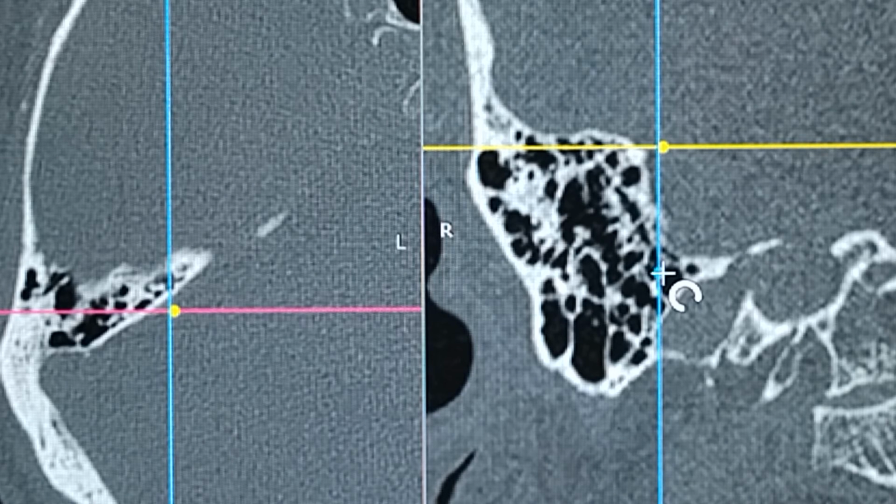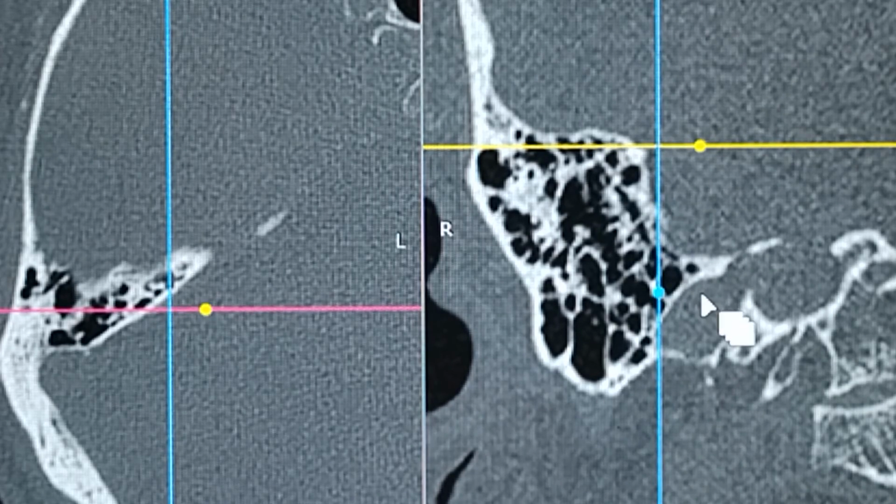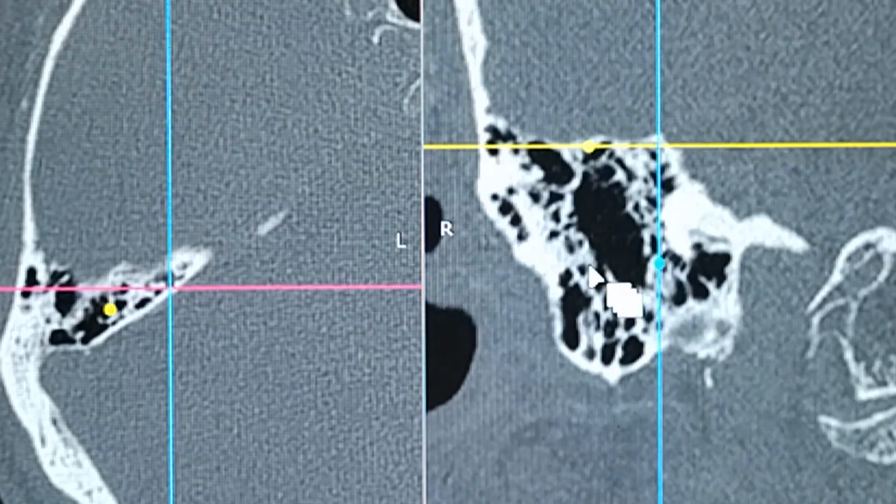As you're coming from the posterior to the anterior, the tegmen plate is sloping from lateral to medial, and that too it keeps on coming medial and inferiorly. So it is coming anterior, medial and inferiorly. So if you're seeing the coronal section right there, see it's sloping right there. See, that's the most lateral part, that's the medial part. Now let me show you the tegmen tympani basically.